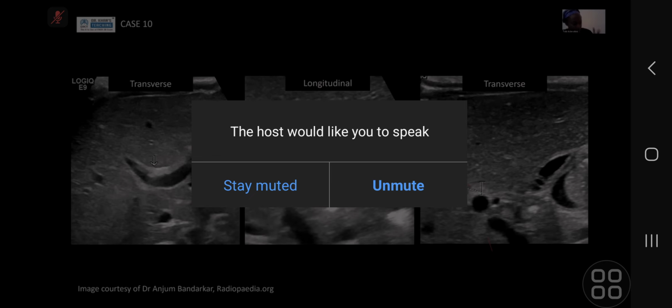So we've got 2 liver cases to show you. Neonatal jaundice is complex. There can be lots of different causes, but one of the causes can be biliary atresia. And basically there are 2 key signs that we look for when we're assessing for biliary atresia. Number 1, you have to make sure before you start anything that the patient is well fasted. So we want at least a 4 to 6 hour fast for the patient, because gallbladder assessment is really important.